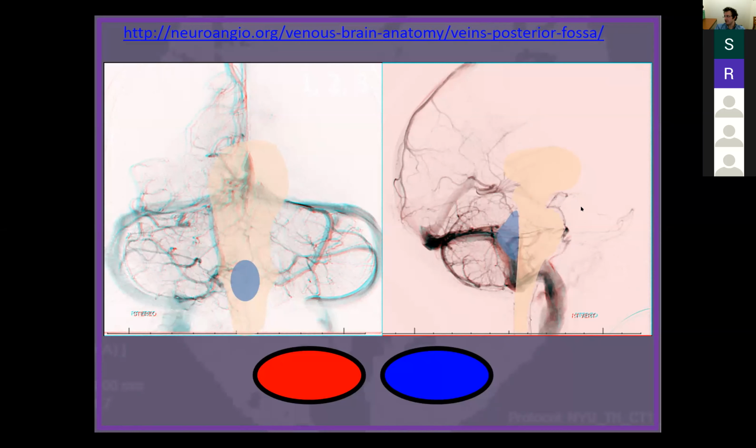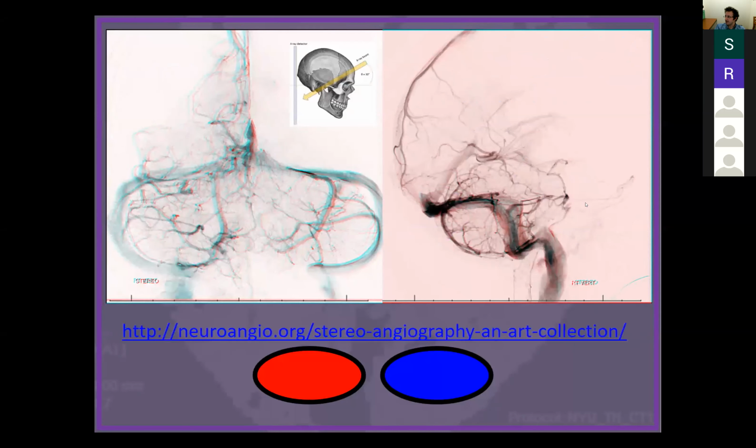So here, for example, if we go back a couple of views, look at this outline right here, that's the outline of the brainstem, right? So here's the pons, the belly of the pons, interpeduncular fossa, interpeduncular vein. Over here is something called the anterior pontomesencephalic vein, right? So there's a mesencephalic aspect, that's the pontine aspect, and that goes down, and that's continuous with the anterior medullary vein, that's the medulla here.